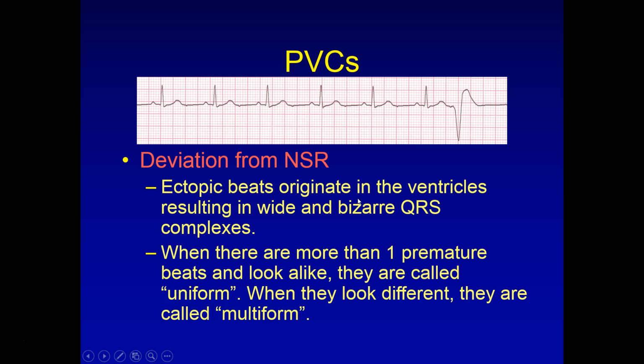That lets us know that it came from the same. Remember I told you in the last video, waves are like fingerprints. Well, same thing goes on in the ventricle. So if you had two PVCs occur in the strip and they weren't identical, then they were coming from two different areas that were irritated within the ventricle. And that would definitely raise a little more concern than if we just had one occur, or one of the same type occur every so often. Okay?